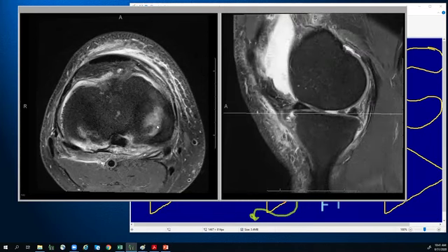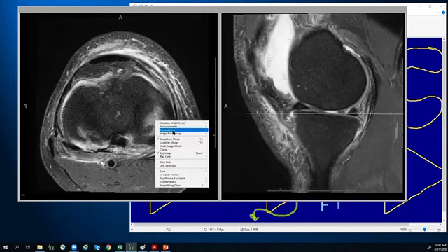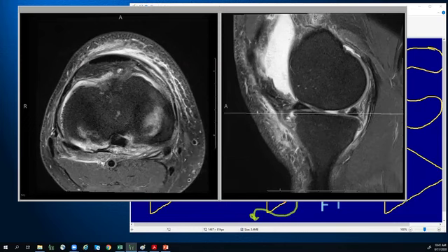And then in the axial plane, all right, great. In the axial plane, when I encounter this region, I'm seeing this displaced edge of meniscus material, and then I'm seeing the rest of the meniscus looking more or less like this. So we have this tear pattern that's involving the posterior horn of the medial meniscus, and it's resulting in this displaced flap of meniscal material inwards.